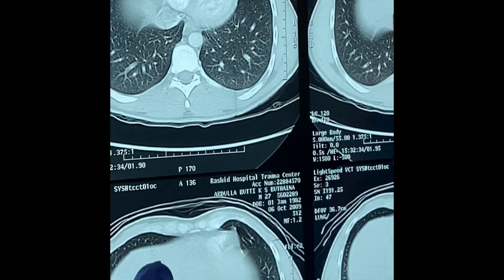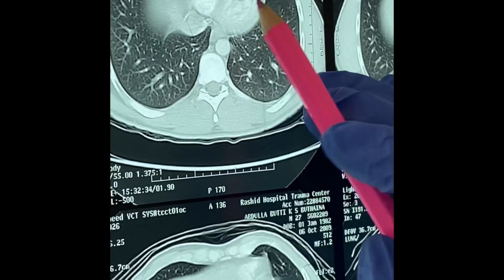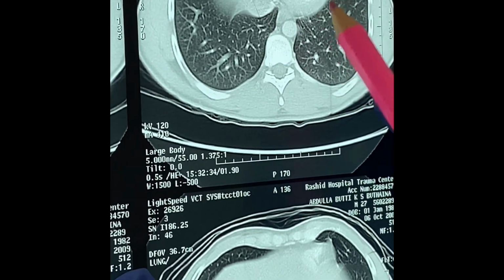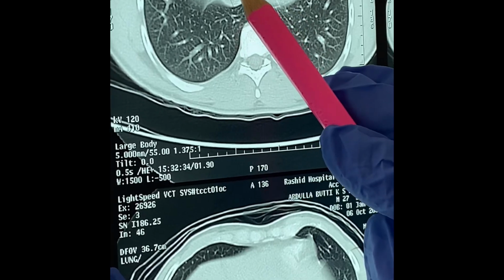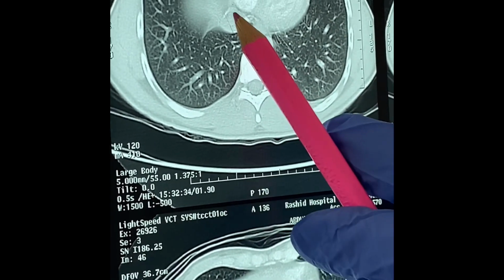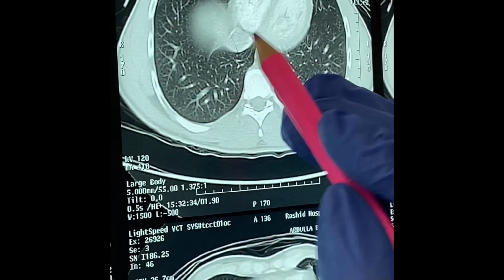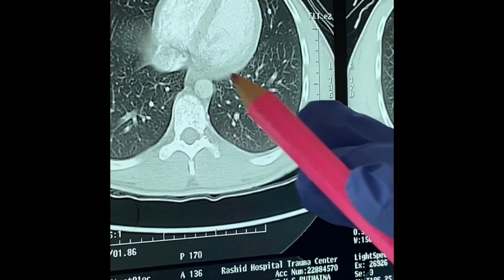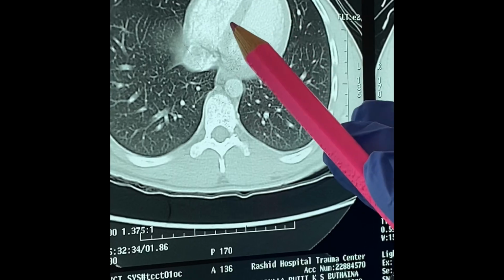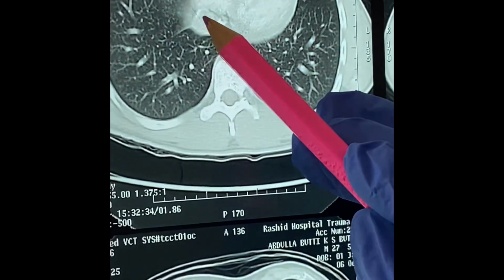Now the liver and diaphragm markings are slowly fading and we are ascending up. Still you are seeing right ventricle, left ventricle, descending thoracic aorta, and a new impression which was hiding under the liver. A new impression has started to appear. This is for our inferior vena cava. So inferior vena cava is in the picture here. So this slide will have the two ventricles, interventricular septum, descending thoracic aorta, and here is the inferior vena cava.